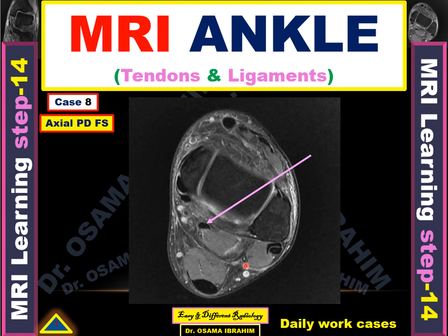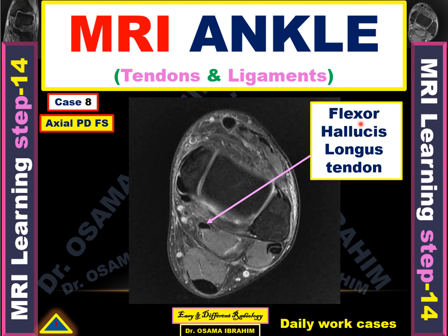Again, this is the medial compartment tendons. There are three tendons, Tom, Dick, and Harry. So this is the flexor group, flexor hallucis, Harry, the flexor hallucis longus tendon.